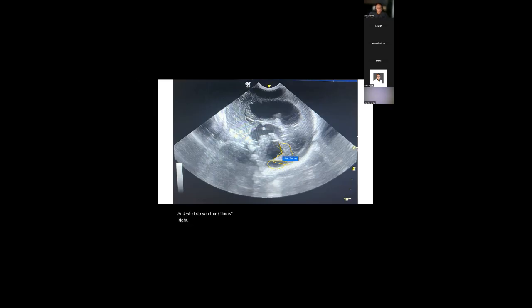And the fourth ventricle is also dilated, which would suggest that you've got obstruction at the level of the foramen of Magendie and foramen of Luschka, which can happen when you have arachnoiditis post-infection, because the whole of the ventricular system here is dilated, third, fourth, going all the way up, which usually indicates a CSF outflow problem at that level. The foramen of Magendie and Luschka go towards the cerebellar view into these spaces over here.